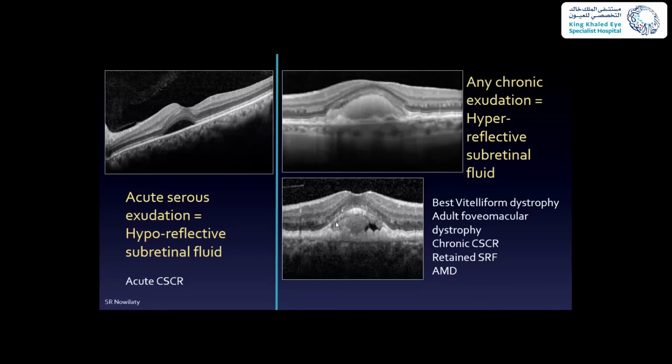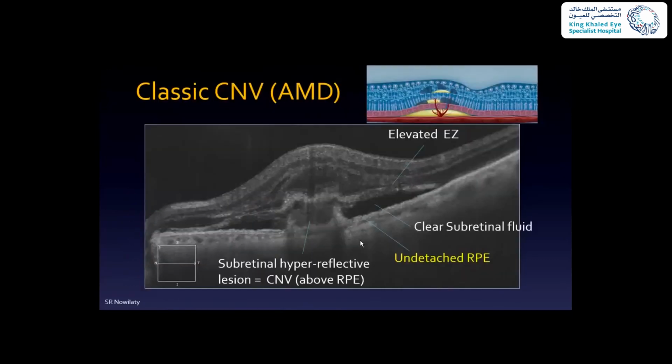And therefore you have a lot of hyperreflective fluid in that area. Okay, so acutely, a central serous chorioretinopathy is going to have subretinal fluid that is serous, but chronically, neurosensory retinal detachment in CSCR or any other neurosensory retinal detachment that exists too long is going to have hyperreflective material. Okay, so remember that.